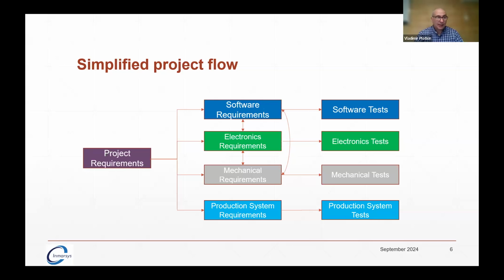So you create the production requirements: end of line testing, how they're going to be testing it, how they're going to be checking it actually works, how they're going to be programming the serial number, manufacturing data, the UDI, which is now required, and things like that. Lots of companies don't know they need to do it, but it's good practice to have it here as well.